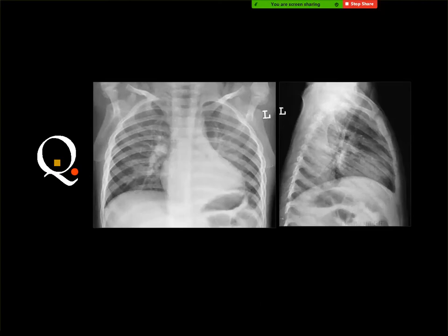There is a prominent right lower lobar pulmonary artery. Vascular anomaly, but I don't know the name. AVM, no. This is a normal appearance because the heart is covering the rest of the pulmonary vessels. Normal. Miliary shadow?